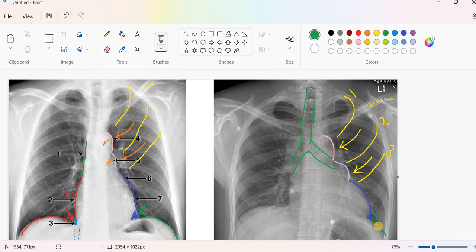Moving and shifting to the right side. Again, I'm going to jump to the most convex part, to the right side of the midline below the bronchi. This will be the right border of the heart, which is the right atrium. Its lower part near the diaphragm is the inferior vena cava. So this is the inferior vena cava ultimately. And if we go superiorly, this will be the superior vena cava. Okay, thank you very much.